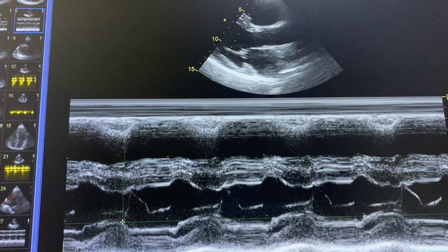Let's see how we can measure. We first select it in an algorithm. I don't know if it is there. Mitral valve. Generic. Where is mitral valve? Mitral leaflet.